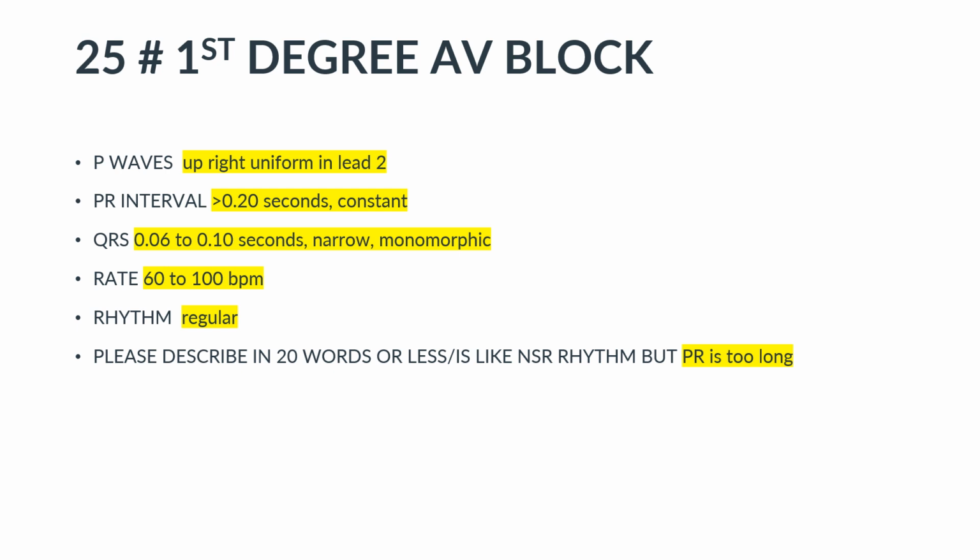All right, so you're going to say, hey, this is normal sinus rhythm with first degree AV block. Or, depending on the situation, it could be sinus bradycardia with first degree AV block. Right, but you get the idea. This is kind of an add-on.